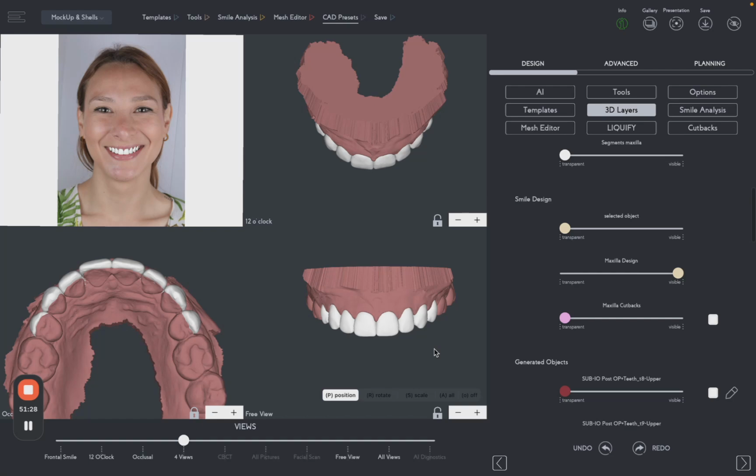Now, before I do that, I wanted to show you the printed veneers design, which also allows you to export these files from the case management. So basically, both the temporaries and the printed veneers files are exported all together from a different folder. So stick with me. I'm going to continue with veneers.